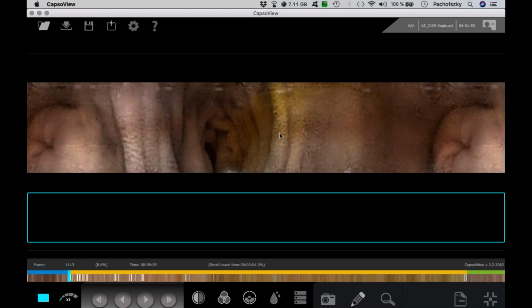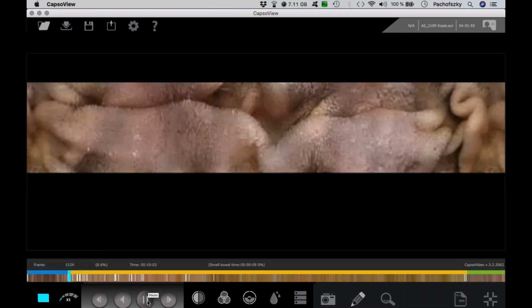You won't see a double sign, but on the side, here is camera number 1. Here starts number 2, number 3, and number 4. And there's an overlap of number 3 and 4 because you have to think that the pictures are wrapped up. So you get this banner, and so you can see on the left side what's also going on the right side. So that's the pylorus. And we will go on.